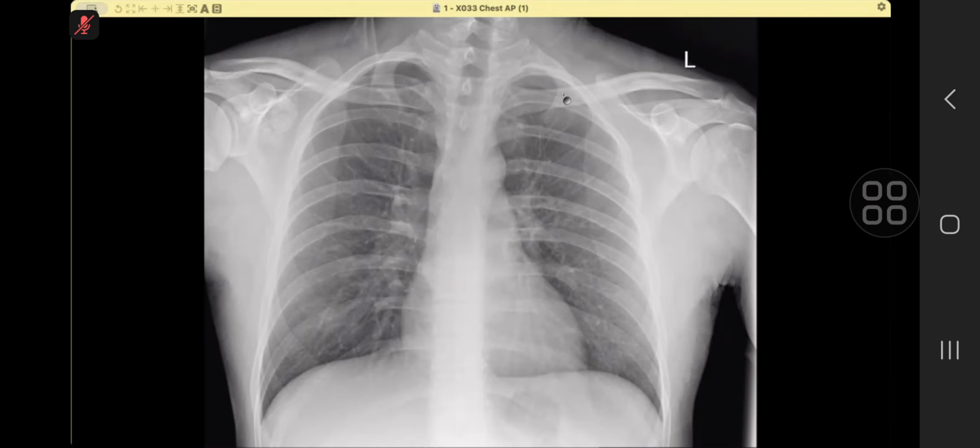So what are you worried about with this finding which you have picked up over the scapula? I assume that these are not artifactual, so these would represent some pathology related to the joint. It could be due to synovial osteochondromatosis or due to hyperparathyroidism.